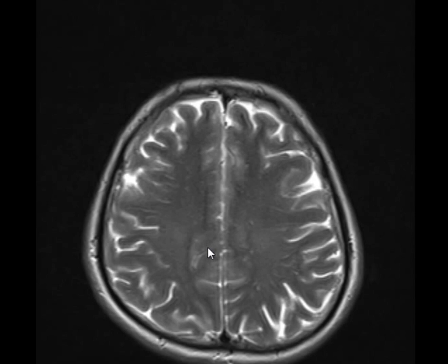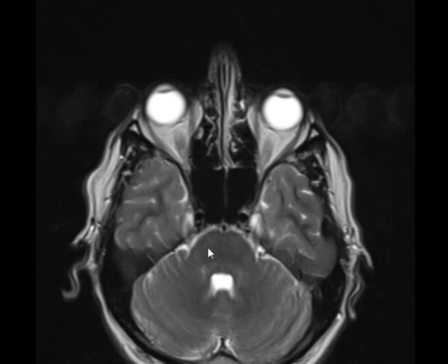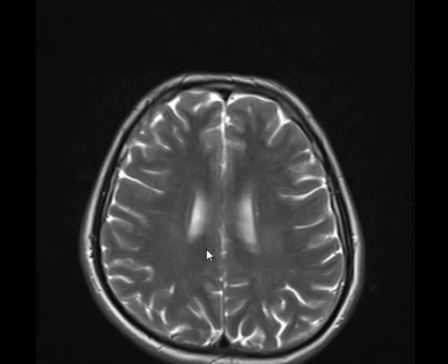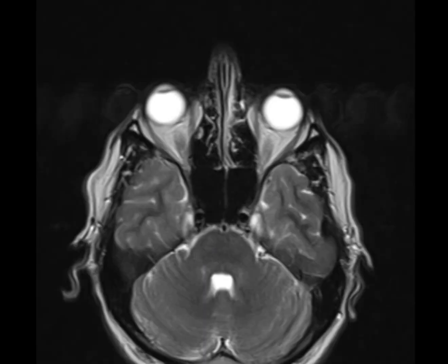Demyelination? Do they appear like that? Demyelination? No, not that. Come on, a 38-year-old. Vasculitis? What kind of vascular? Vasculitis. Wow, big jump to vasculitis. These are excellent, beautiful. These are Virchow-Robin spaces, perivascular spaces.